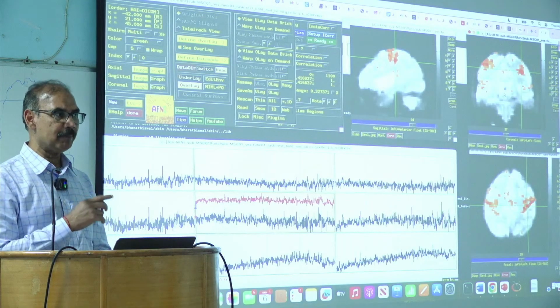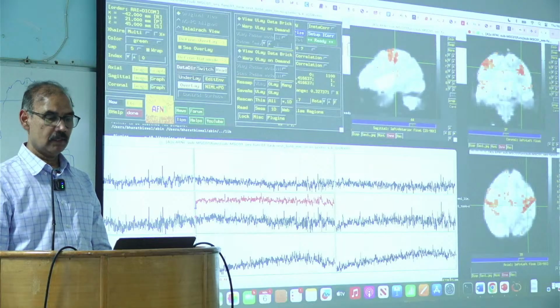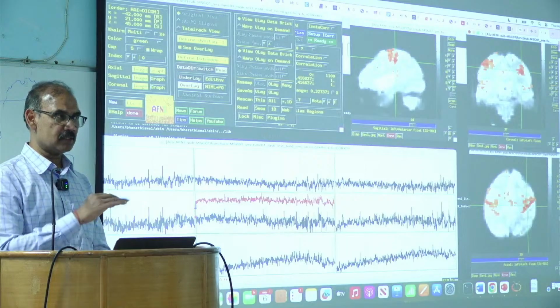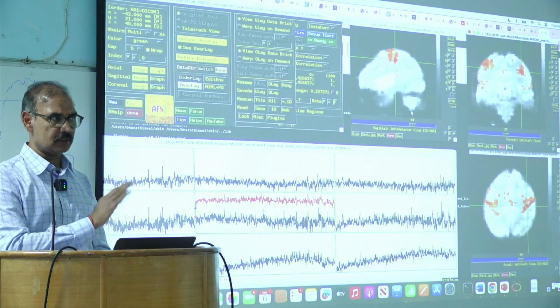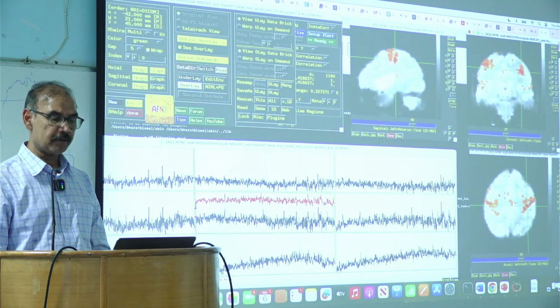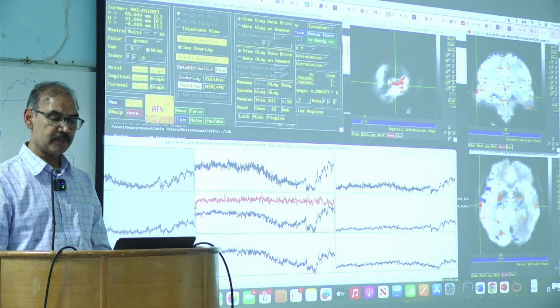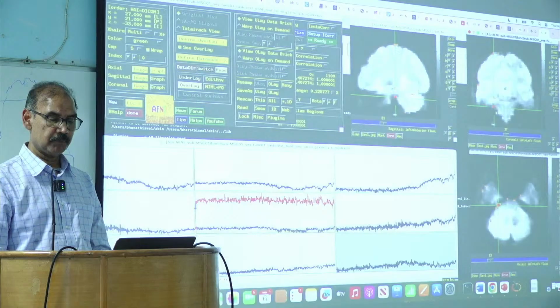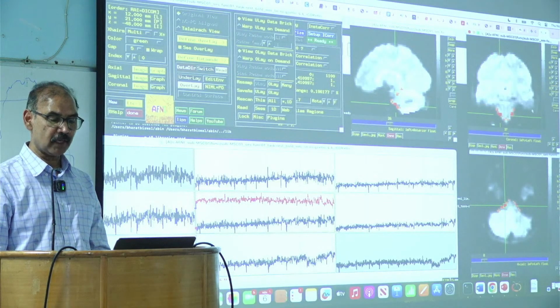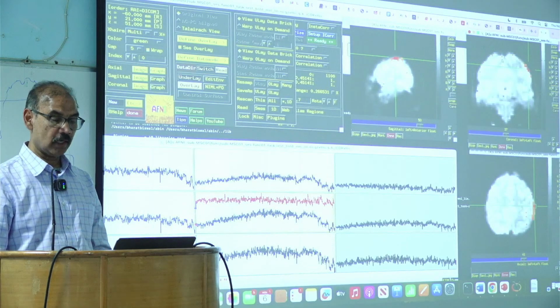Can anyone tell me what would happen if I went to the edge of the brain and did connectivity analysis? Let's say here. I haven't done anything. This is the raw data. I haven't even skull stripped it, I haven't used BET or an MNI template, nothing. So if I go to the edge, generally I would see most of the voxels around the edge. Maybe my threshold is a little high, so we don't see anything, but that is how the edge would look, mostly on the edge.